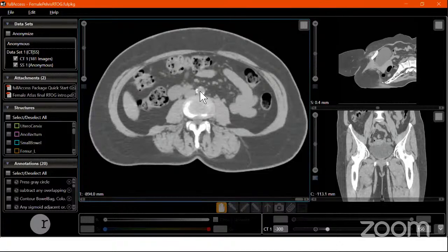So let's start from the top and then go down. Let us do a quick scan from up downwards. Of course, when we take scans, the upper part of the scan is determined by the previous staging. If the patient has had paraortic nodes, we would have to keep the upper part of a simulation scan starting right in the mid thorax, and then coming down onto the mid thighs. So this would be the entire scanning region if you're going to include paraortic nodes in the treatment volume. And if there are no paraortic nodes, we can very well stop the upper border at the xiphisternum.